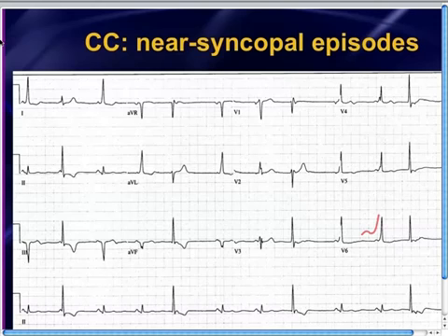And so this patient actually has WPW, and WPW was missed on the initial formal interpretation. Why was it missed? It was missed because people were simply looking for delta waves in a couple of leads, and you don't see delta waves in a couple of leads. You see delta waves sometimes just in those anterolateral leads. Sometimes they're just in the limb leads.